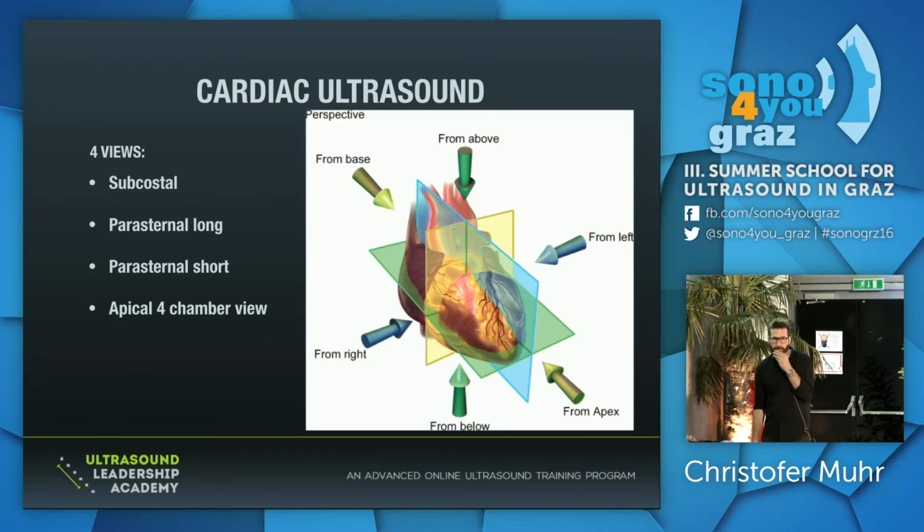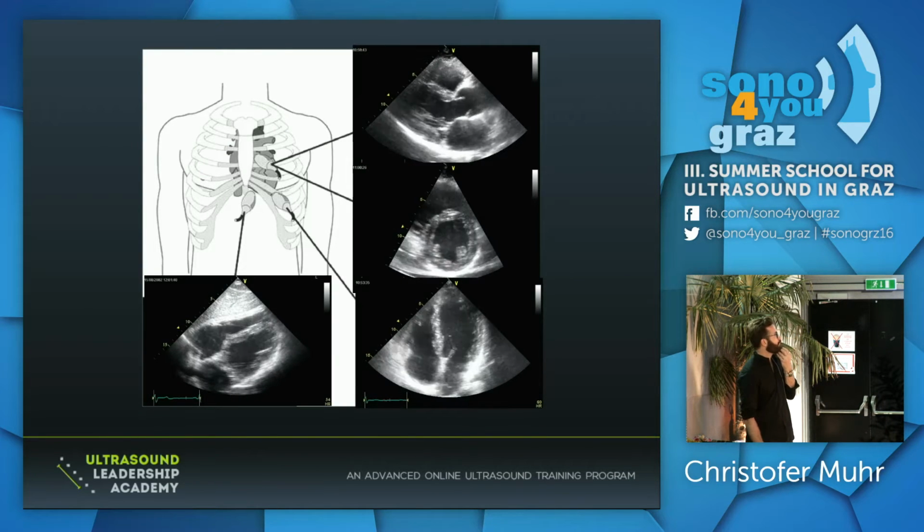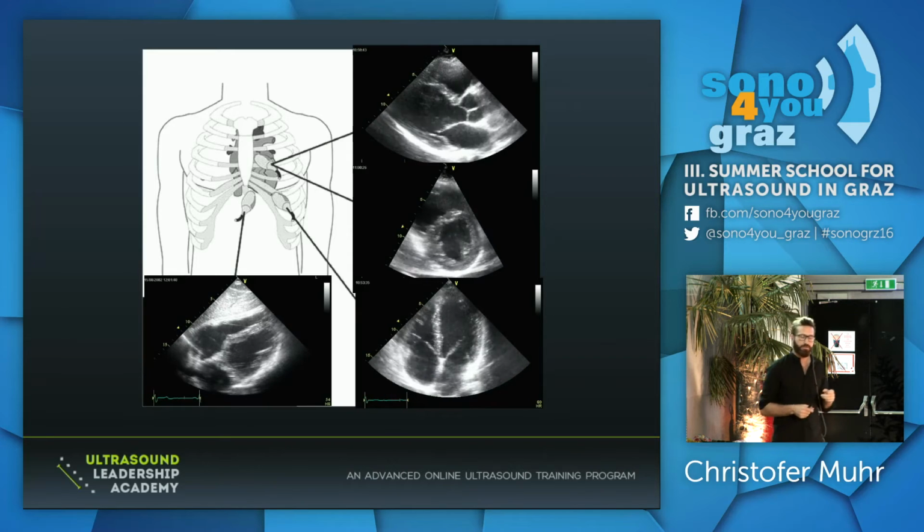Same thing again here. Okay. I think you know all these views, and we've done that. And preferably, if we're lucky, we get views like this. But still, you can make so many diagnoses of just getting this view and just getting this view. But as we said, if you see pathology, you want to see it from two views. Okay?